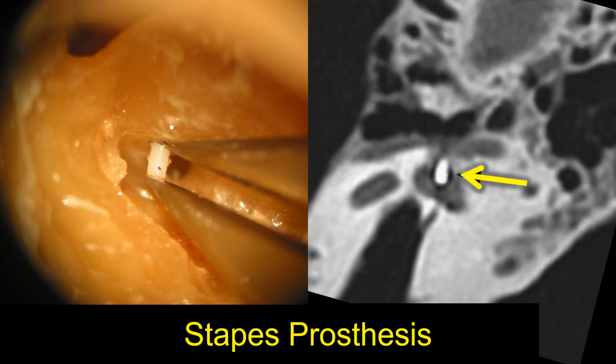So we showed in this way that some of these stapes prostheses do stick out quite a ways into the vestibule through the oval window niche, but some of them are actually made to do that, so that's okay. It's more important whether or not the stapes prosthesis is working when we evaluate those studies. So it may be normal to see some of these extend into the vestibule through the oval window itself. That's okay. It's more important whether or not it's working. So those are the stapes prostheses in those cases.